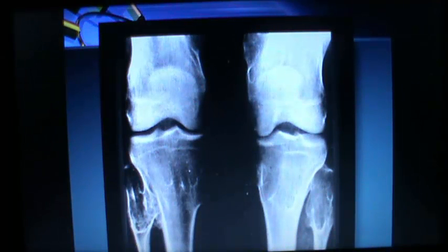This is the appearance, showing continuous marrow into the lesion and directed away from the knee. From the knee I flee. If we have a lot, this is multiple, what we call diaphyseal aclasis, multiple exostoses.